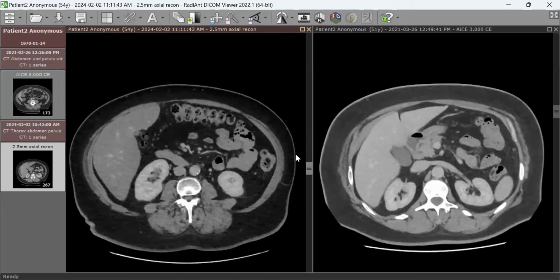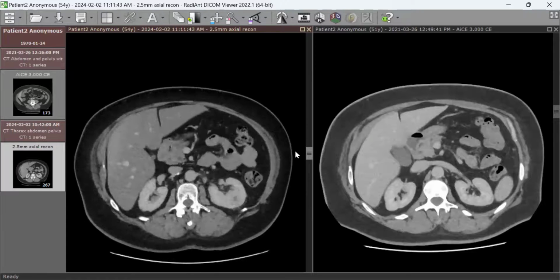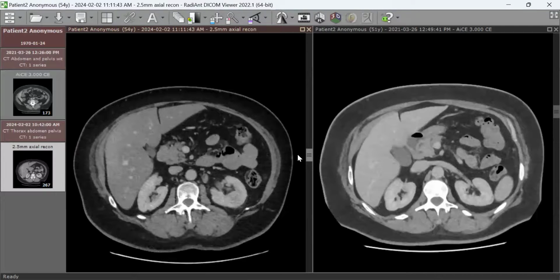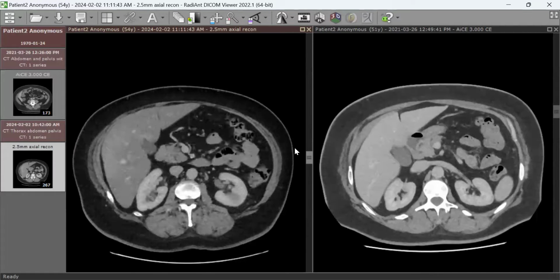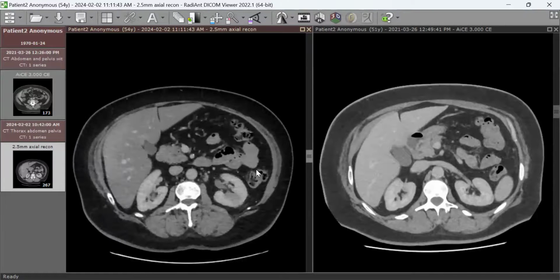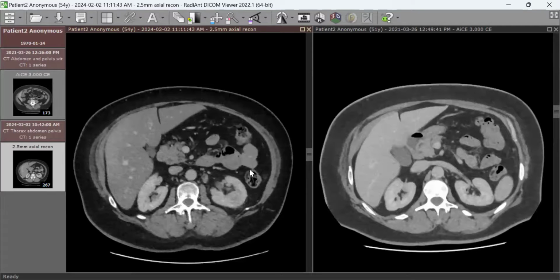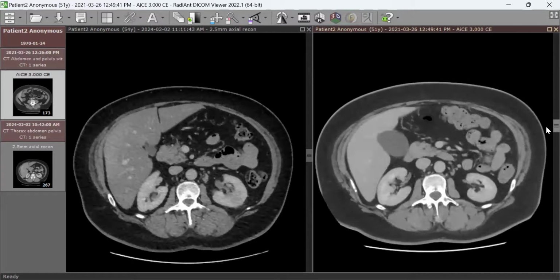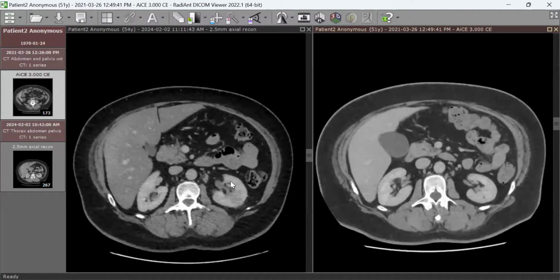If there is regional lymph node, where? Around perirenal, or if there is periaortic lymph node. Yes, this one is borderline size, barely, it could be like 9, 10 millimeters short axis, which is important. Compared to the previous one here, it was slightly smaller with more prominent fatty hilum. This could be involved, could be not.